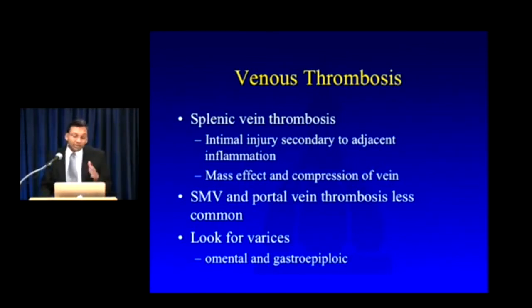that you're missing. Now, this is one of the reasons why I really do believe patients need dual phase studies to look at pancreatitis, because many of these vascular complications, especially on the arterial side, can be really tough to see on the venous phase.